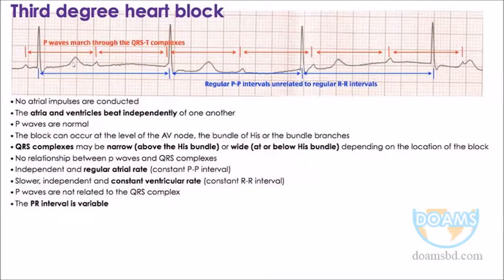If you look at this, you see this is a P wave. And interestingly, another P wave is here, at the beginning of the QRS complex. So sometimes identification of the P wave becomes challenging. If you find that this is the P wave, in between there is no QRS, and after this P wave, QRS is visible.